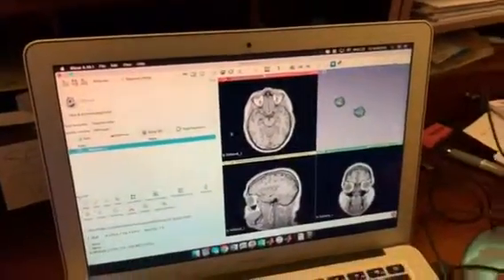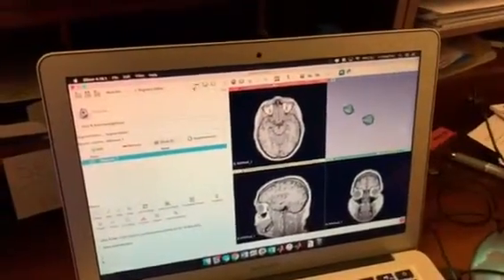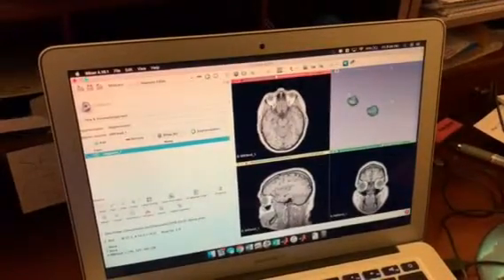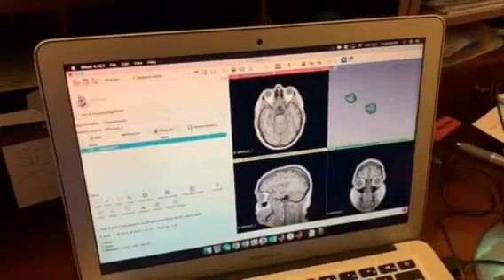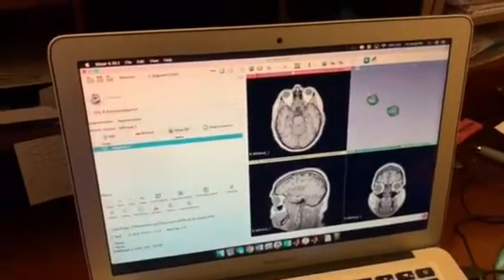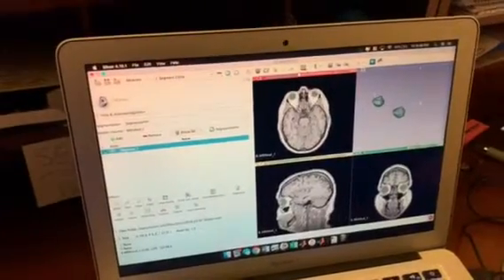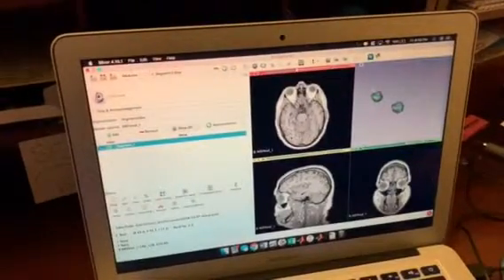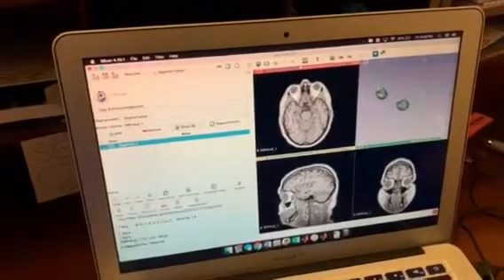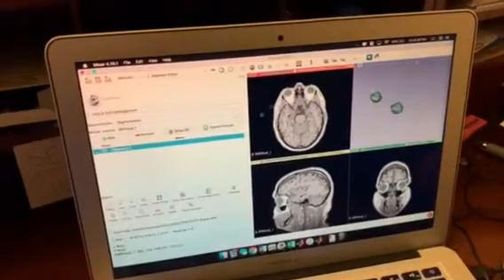This is my project for BME 7200, project 2. The first part of the project required segmenting and slicing something from 3D Slicer. Originally I had sliced the forebrain, but MATLAB 2018B, which was required for the image processing toolbox, ended up crashing my computer and it didn't save the segmentation that I did. So due to lack of time, I decided to just do a simple segmentation of the eyeballs.